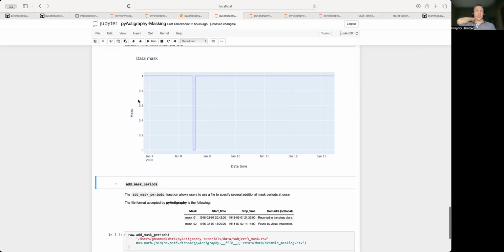That's maybe good just for testing purposes, but if you want to keep this information somewhere that you're going to reuse, and that maybe the next generation of people analyzing the data might want to reuse, you might want to keep this information somewhere.